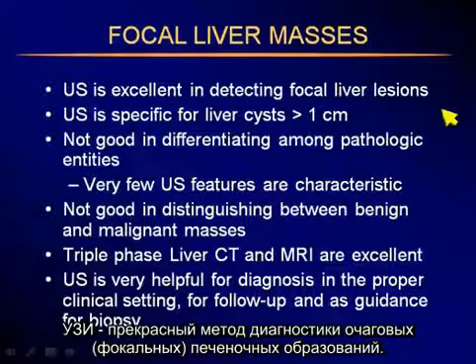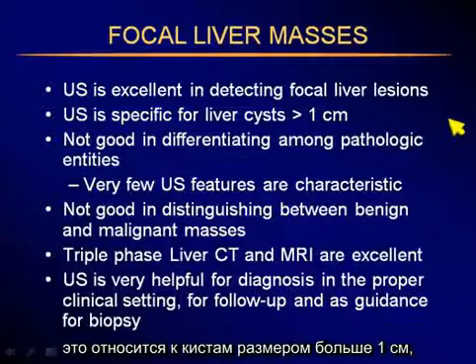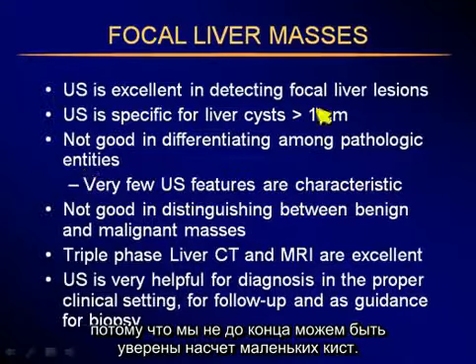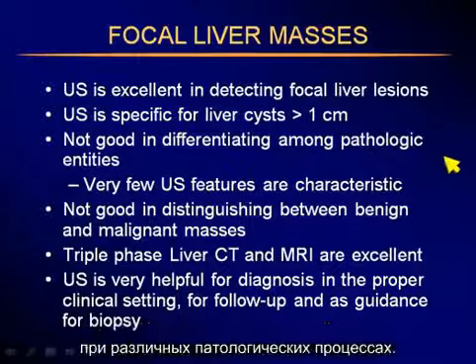Ultrasound is excellent in detecting focal liver lesions. We're very specific for liver cysts, but liver cysts that are about 1 centimeter or more, because very tiny ones we may not be so sure about. But ultrasound is not good in differentiating among the different pathologic entities.